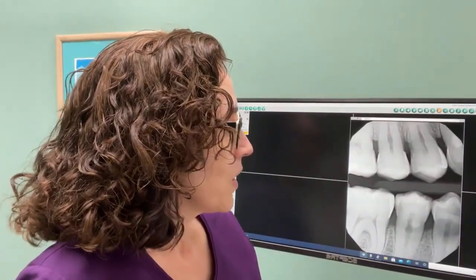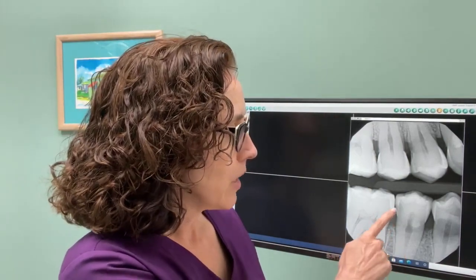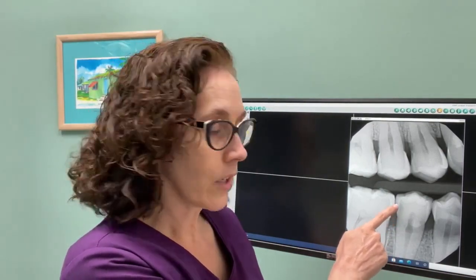So we're able to see the decay on natural teeth and how it goes into enamel, but we can also see it on teeth, for example, that have crowns that are all the way up at the gum line, where you can't see it or feel it very well. Another thing that we can see is how deep or how far the decay goes. In this example, you can see that there's decay here on the back side of this tooth, and you can see a dark shadowy area that comes in this direction.